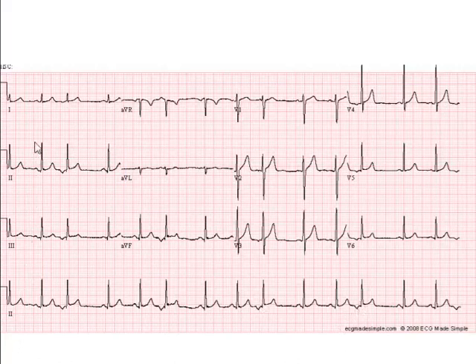Now we examine the sinus P waves a bit closer, and we can see that they are normal in the inferior leads and in lead V1, suggesting that there is no evidence of left or right atrial enlargement. In addition, the sinus PR interval is normal. The QRS axis is positive in lead 1 and positive in AVF, suggesting a leftward inferior axis, which is normal. Because the QRS complex is narrow and sharp, there is no evidence of any intraventricular conduction delay.